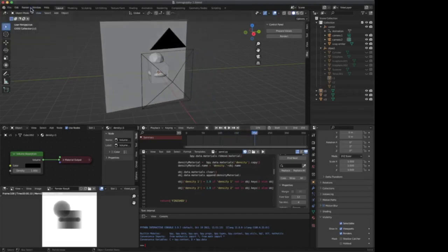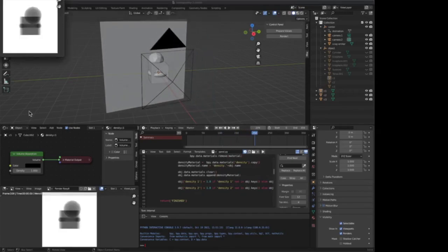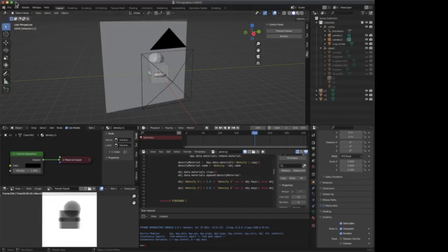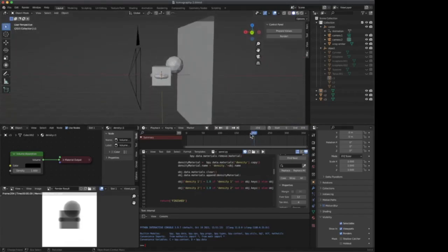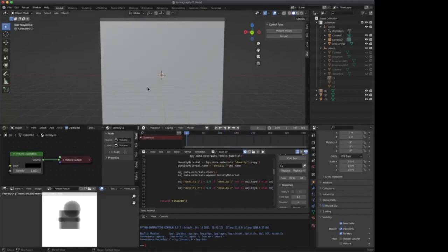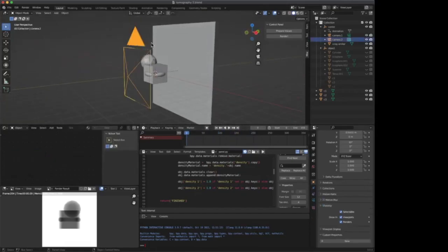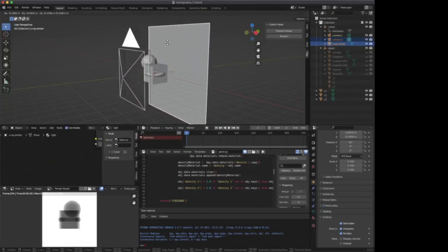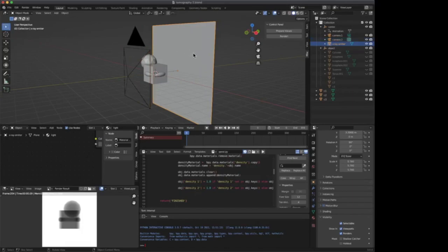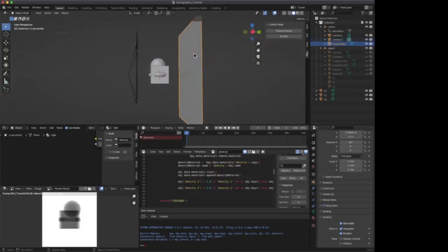With each image, we can assemble sinograms for each row of the image and use any back projection methods, like the inverse radon transform, to reconstruct each slice. Since Blender is a drawing tool, the flexibility is limitless. We can emulate any geometric artifact like imprecision in the center of rotation, detectors geometry, helicoidal paths, etc.